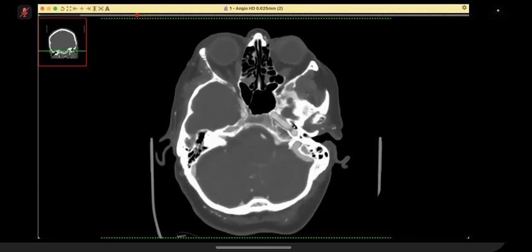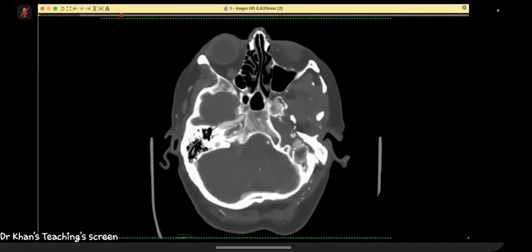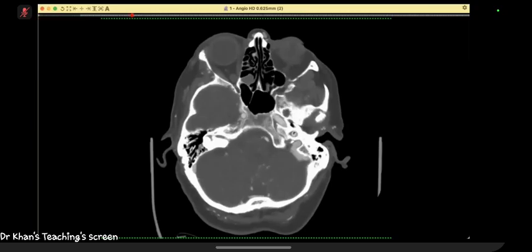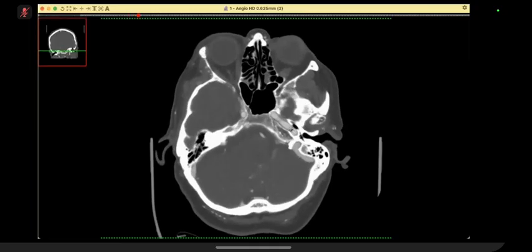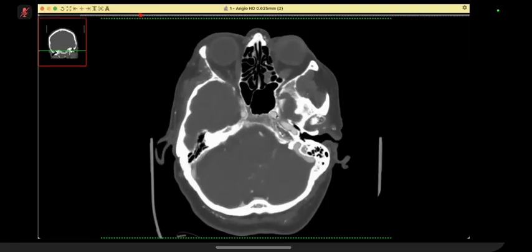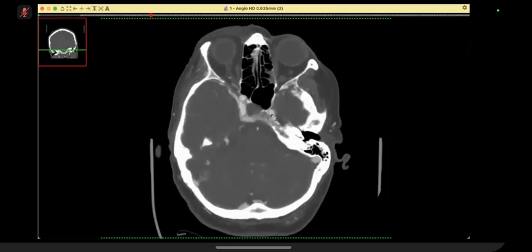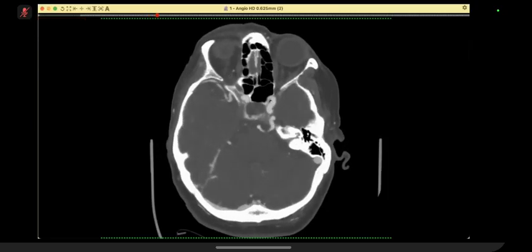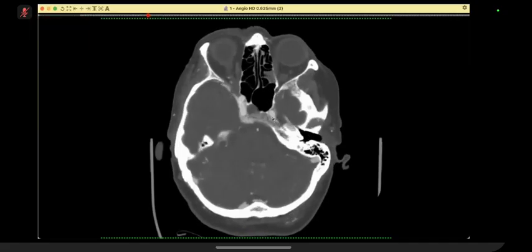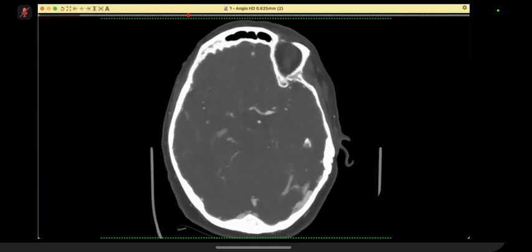So let's trace the carotid artery, internal carotid. So internal carotid, we have gone into the neck. There is a vertical portion as we enter the base of skull. And this is the vertical, and then it becomes horizontal. This is the carotid canal in the temporal bone. And it will pass over the foramen lacerum, and then this is the cavernous portion. And then it will pass through the cavernous sinus. And in this region, you can see this connection. So that is what it is. Well done.